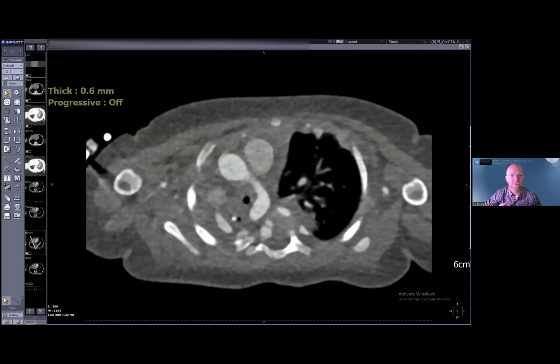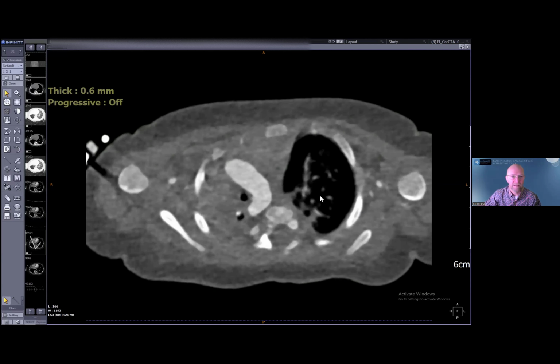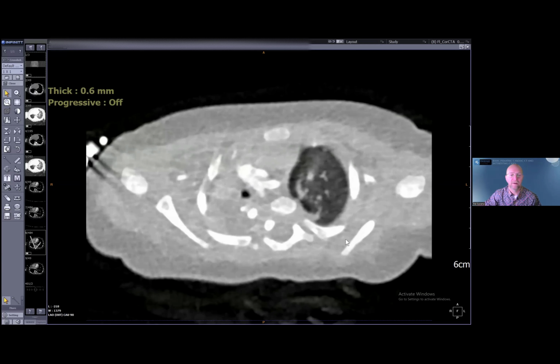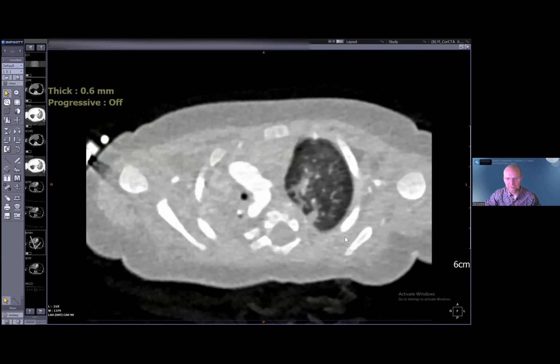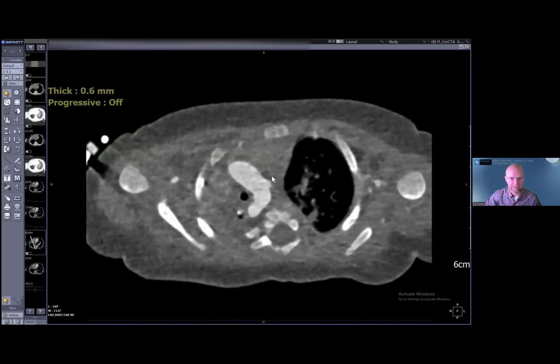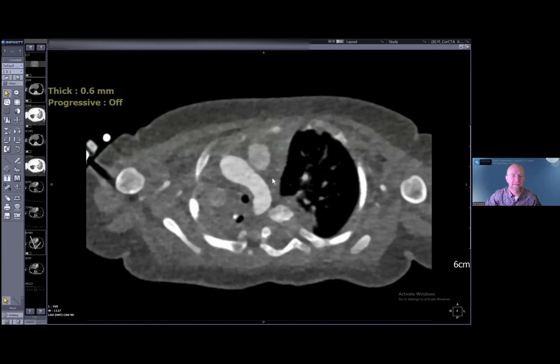Let's talk a little bit about those two additional areas in here. One in the left upper lung anteriorly, maybe the upper lobe. There seems to be some loss of aeration, maybe some consolidation. And then there's a big soft tissue to the right of the mediastinum, which is probably just thymus. But I bet some people would like to know what's going on in the actual lungs, because to me it looks like that left-sided lung that's not aerated is partially enhancing, partially not enhancing. So some of it is probably atelectasis, but some of it may be actually infection.